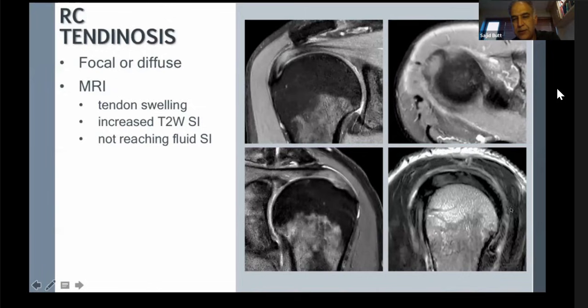That's the anterior, that's the posterior, that's the supraspinatus, and notice how thickened it is. In the axial image, anterior, that's the posterior, you've got excessive thickening of the supraspinatus with bright signal intensity. This is not magic angle. This is a real finding because you can see it in the long TE, T2 weighted sequences also.